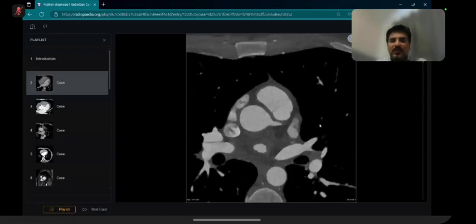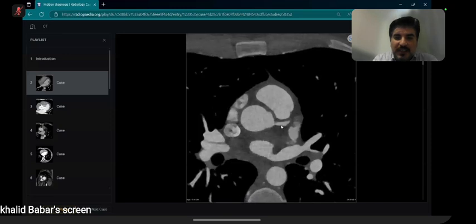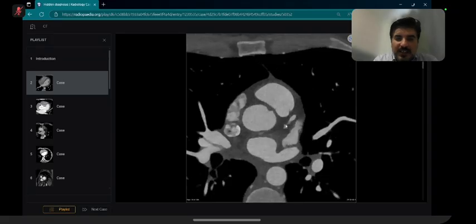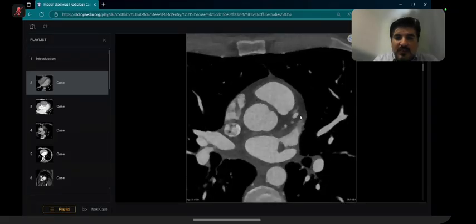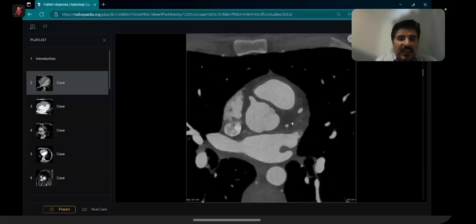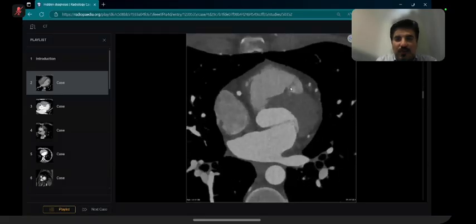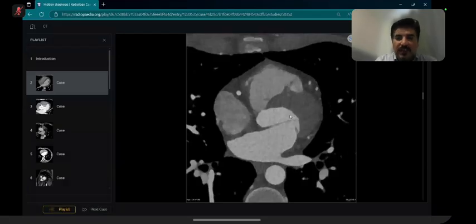Now going towards the other coronary artery. So this is the left main coronary artery. It is usually 1 to 2 centimeters long, and it immediately divides into this anterior branch, which is the left anterior descending artery, LAD. As the name indicates, it travels anteriorly in the interventricular groove. So this is the right ventricle, this is the left ventricle. It is traveling in the interventricular groove anteriorly.